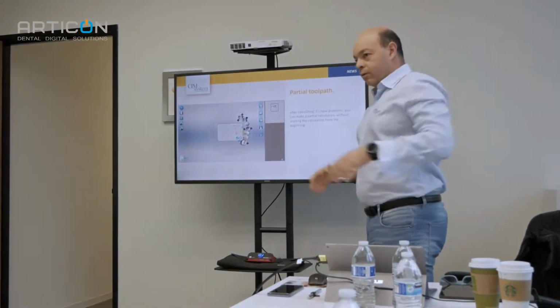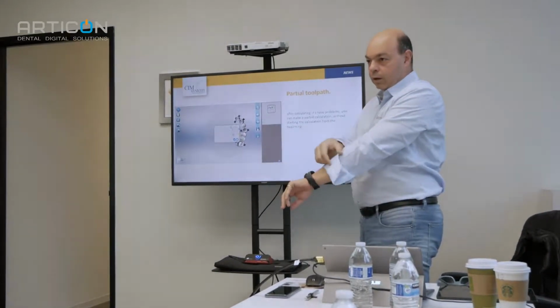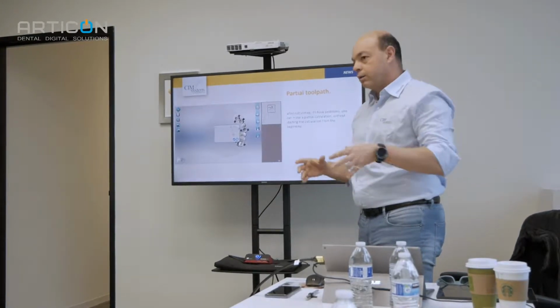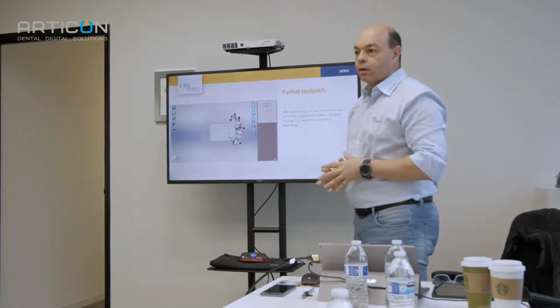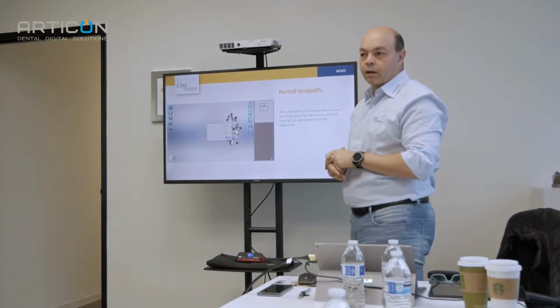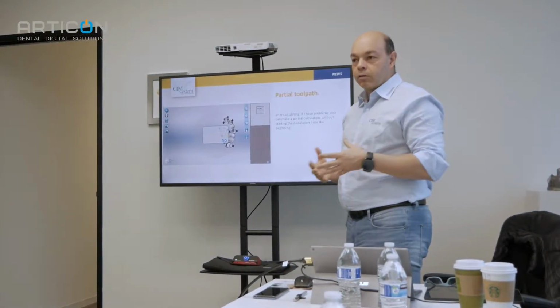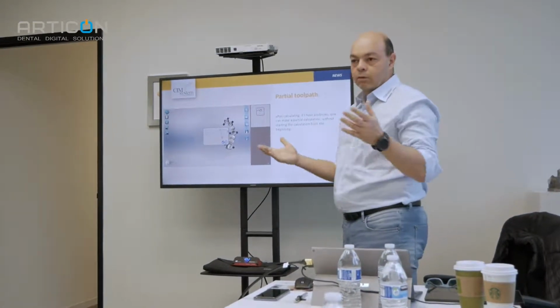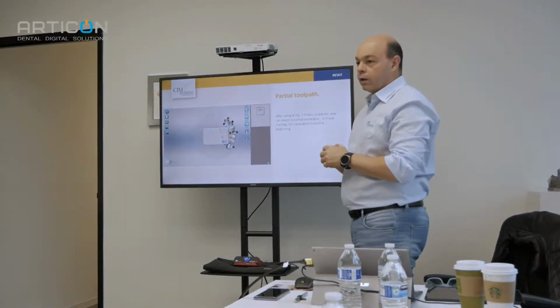In this first part I show you the news in the software. In the second part I start one live demo. I start to import one small crown and I arrive to the calculation. And after lunch, I think I will start to manage the implant bridge and small abutment, and at the end of the day, questions and answers. Okay, I start with the news.